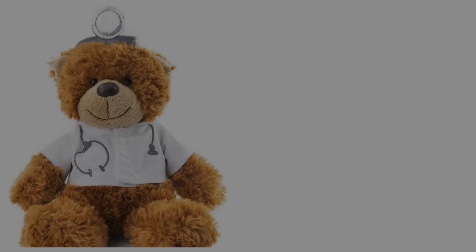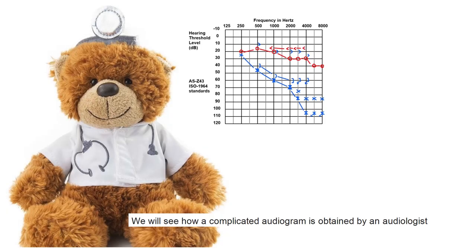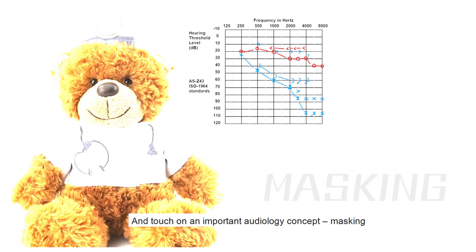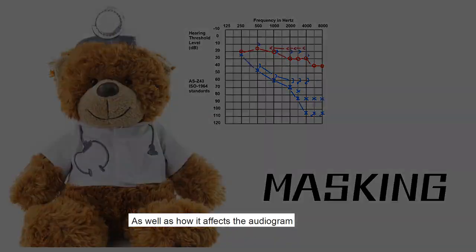Today's video is designed for health professionals. We will see how a complicated audiogram is obtained by an audiologist, so we can understand it very well, and touch on the important audiology concept, masking, as well as how it affects the audiogram.